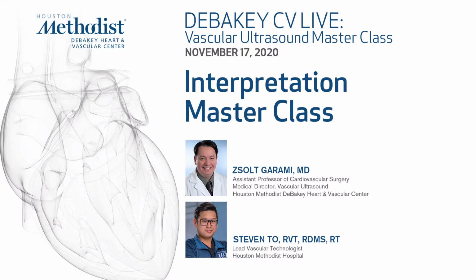We are going to give you a few cases of interpretation masterclass, and these are again not our normal studies. Hopefully we'll learn how to interpret those difficult vascular cases.